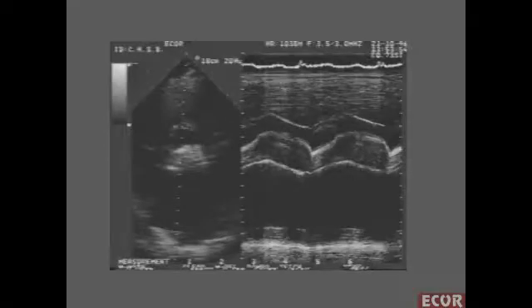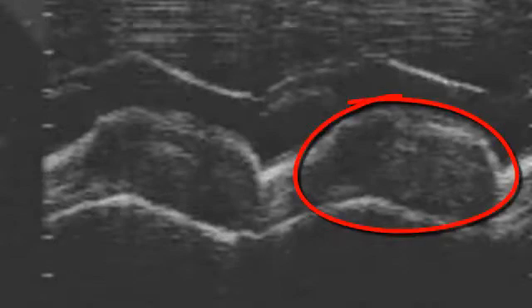Now, the M mode of the valve. Is it calcified? Absolutely not. That is a huge vegetation. 2D echo cannot differentiate it. For the M mode, it is very easy. See the smudge aspect. No characteristic lines with clear border as seen in calcifications.